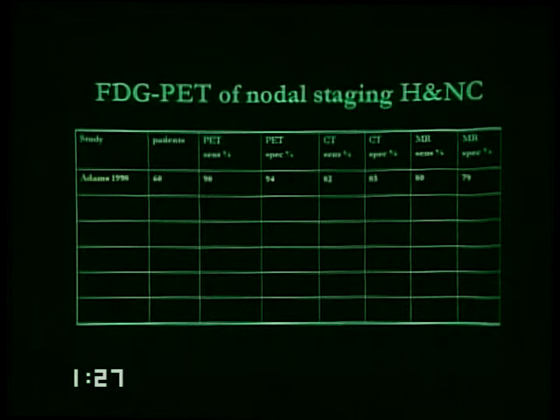But looking at the numbers, if you consider all these artifacts, and the more you read PET, the more you're going to be aware of the artifacts. If you use PET-CT fusion or registration software or hardware, look at the numbers.